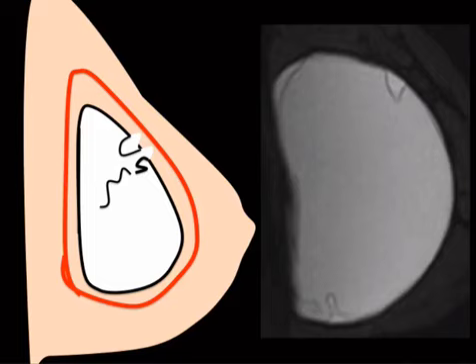And these things look like, well, the buzzword is going to be like a linguine, like a piece of linguine, like this guy. Sometimes you'll see it where it's floating full on like that. I've got a case of that I'll show later. Notice that this piece here is not attached to the wall. That's a big difference between that and radial folds. Radial folds, everything is sort of attached. This thing, you can imagine that there's a tear here, like right there. Like it's intact here, and then there's a hole there.